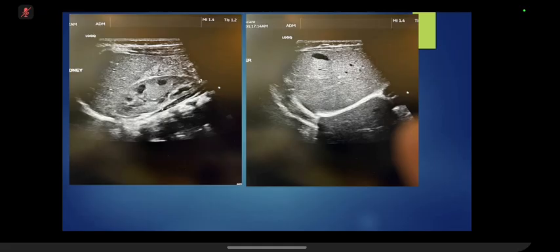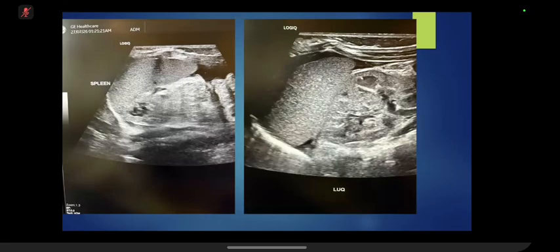The right kidney is in focus and appears normal in size. There is no evidence of any hydronephrosis. The pleural space also appears to be normal in these spot images. I also visualize the gallbladder, which appears to be normal.